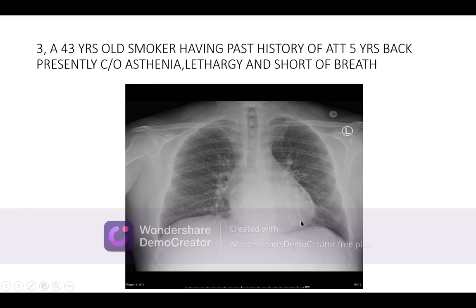This is a very important heart sign of the disease. This is the right border of the heart, and this is the upper part of the middle mediastinum. Here is the ascending aorta, this is the arch of aorta area, this is the pulmonary conus. It is normal. You cannot find anything.